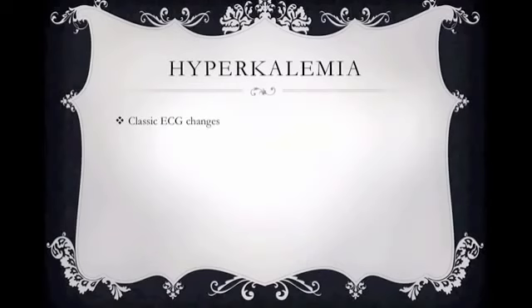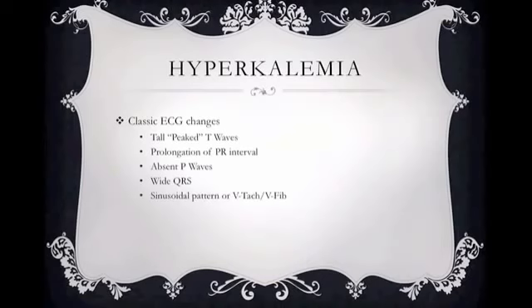Hyperkalemia. Now, what are the classic EKG changes of hyperkalemia? Well, the books are always going to say you got the classic five, always in that order, according to the book. We get the tall peaked T waves, we get prolongation of our PR interval, then we get our absent P waves, then we get a wide QRS turning into a sinusoidal pattern or eventually VFib. All right? But patients don't always follow the book, and there is no evidence that correlates potassium levels to any one of these EKG changes.